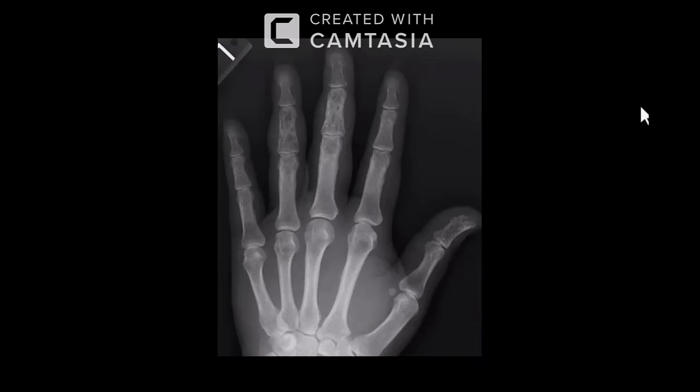I can see there is a soft tissue swelling surrounding these bones. Looking at the rest, looking at the terminal phalanx, they are unremarkable. The rest of the joint spaces are unremarkable too. So the appearance is sclerosis with lucency in both middle phalanges with soft tissue swelling.